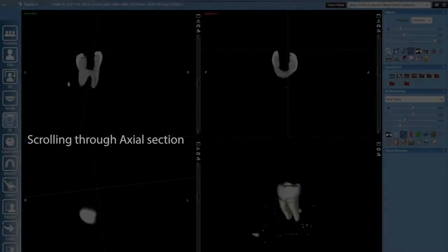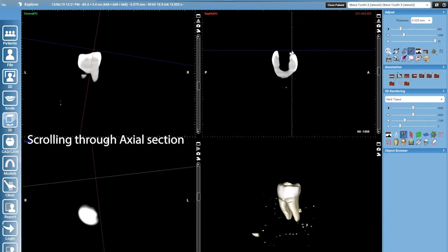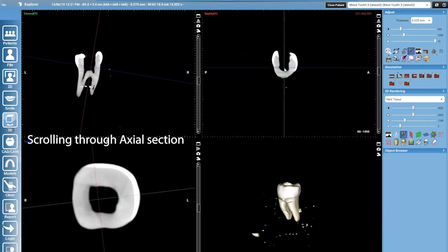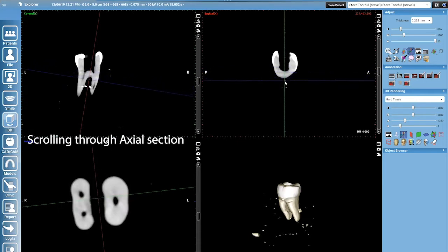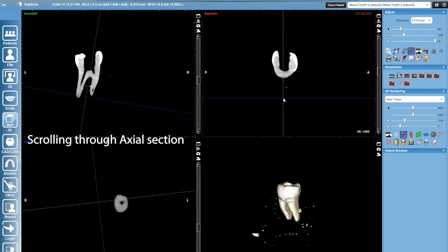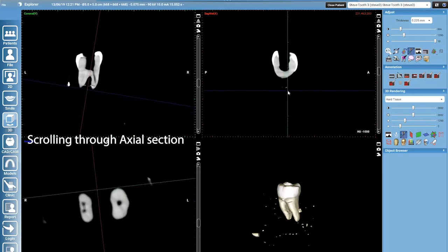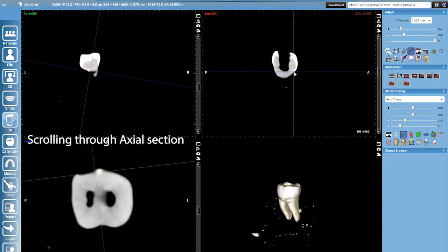And just coming back through the axial system, make sure you don't leave on your model big chunks of amalgam when you do a CBCT, otherwise you do get these flashes. You can see them in the lower section here. I apologize for not cleaning the model there. And then scrolling back up, just look at the centered nature of these preps. They're really beautiful in these very curved canal systems.